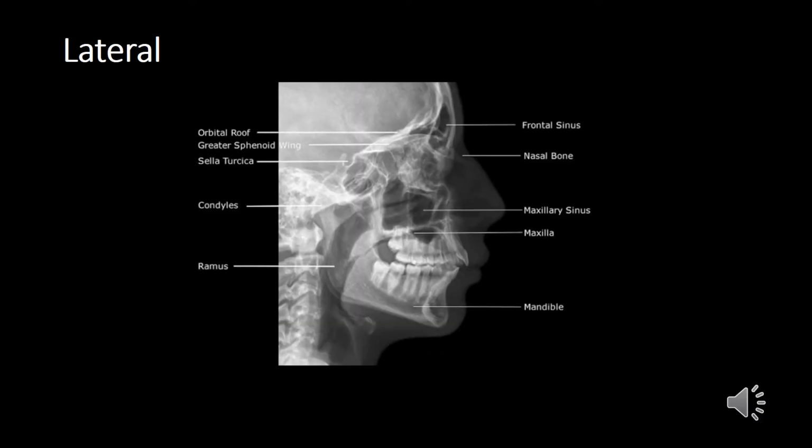And here we have the lateral view. Not normally done for facial bones, it's fair to say, in a trauma situation. Nevertheless, take a look, make sure you know where the anatomy is.